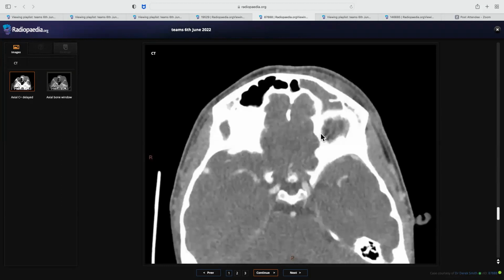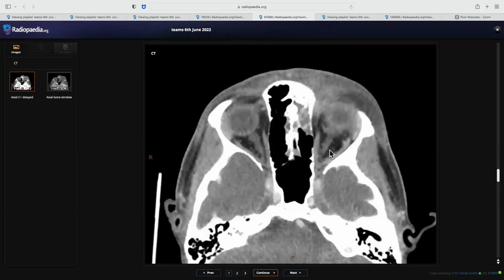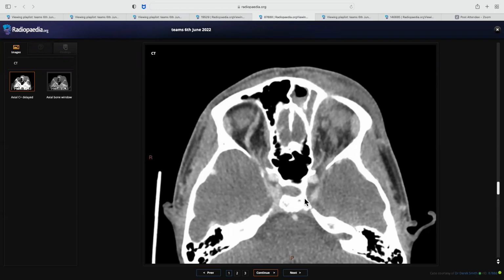And then if you compare the cavernous sinus, see here and see here, you very well picked the superior ophthalmic vein, and you also said that you will look for it, which is very good because sometimes even if we say it and we are not able to find it, it's still fine because they know in the exam pressure you might not be able to pick it up, but at least they know that you know what to look for. So it was very good that initially you said that I will look for the superior ophthalmic vein and cavernous sinus. They know that you know the thing and you will look for it in your routine practice. When you have more time, you will be able to find it. So it's okay if you couldn't pick the cavernous sinus finding. It happens in exam time. It's completely acceptable.